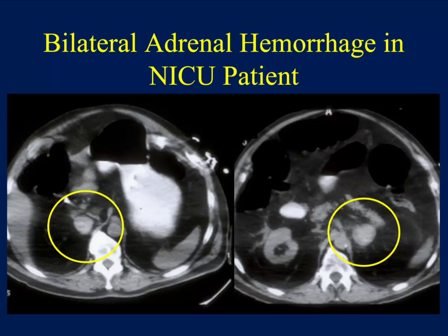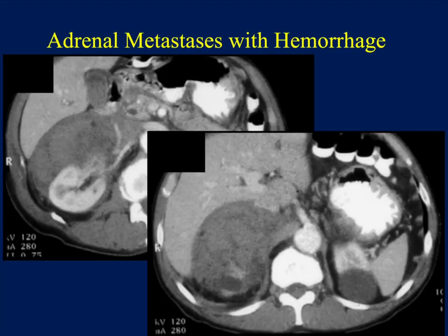Here's another example. This was an ICU patient who had a benign meningioma resected and was doing poorly. They thought maybe the patient had an abscess, something going on. They couldn't figure out why. Well, bilateral dense adrenals, bilateral hemorrhage. We called up immediately. We said the patient is probably Addisonian. That was the case. We saved the patient's life. It's rare for us to ever get recs that say rule out Addisonian crisis and adrenal hemorrhage, except for the 2 weeks that follow when you make a diagnosis like this.